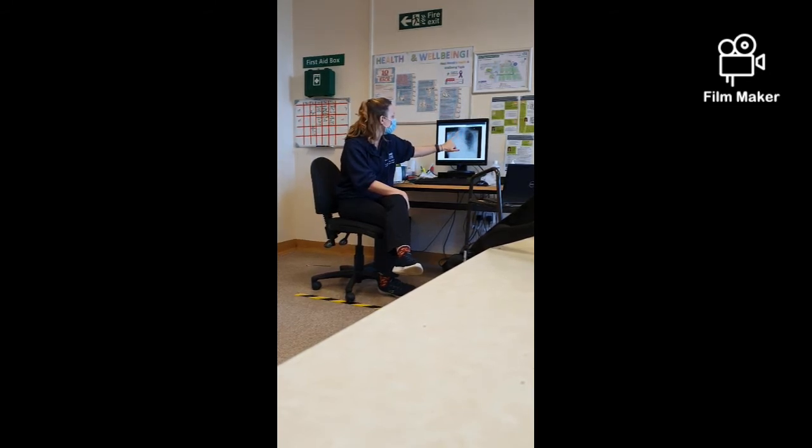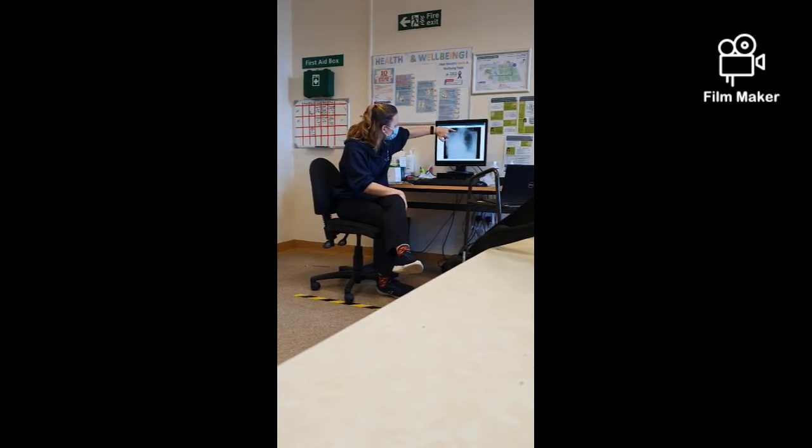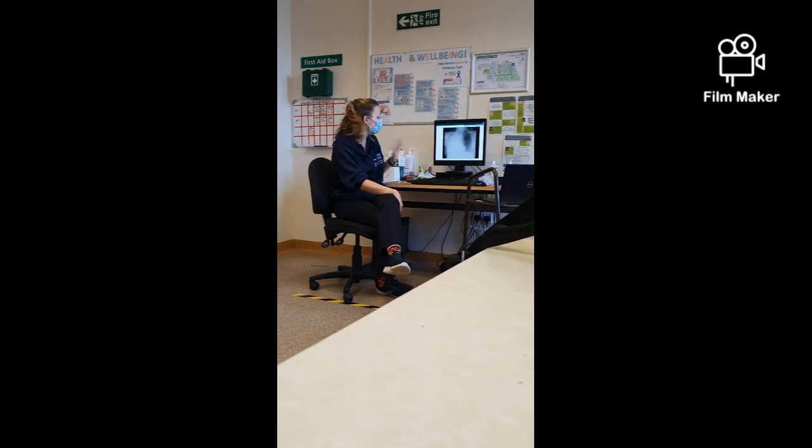It's very much deflated. It's not elevated and horizontal. Can everyone see that? It's very difficult to see the ribs here, but this is more clear that your first rib up here is actually angled further down there. Can you see that? Yep.